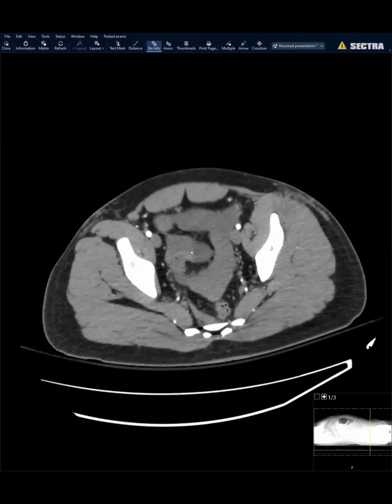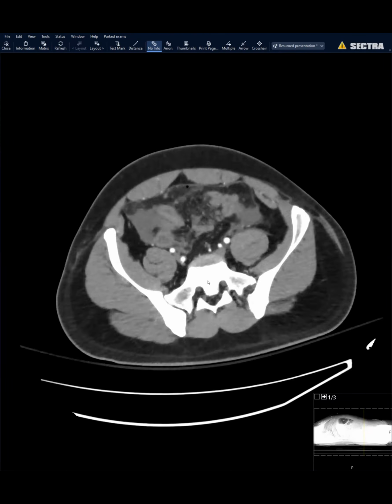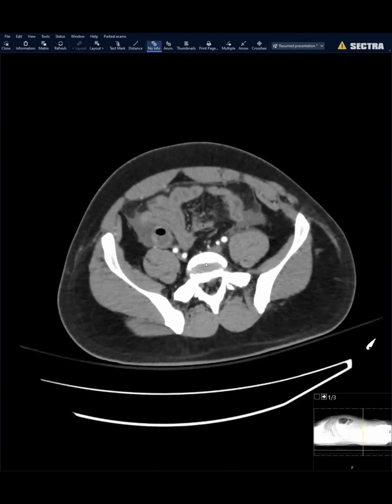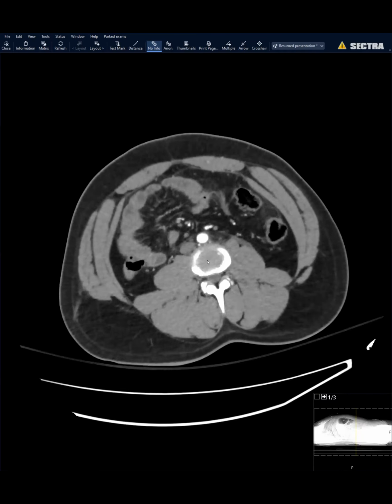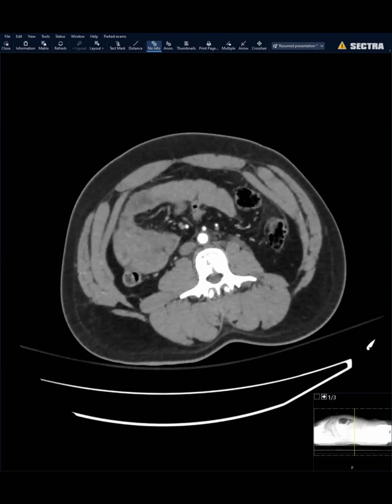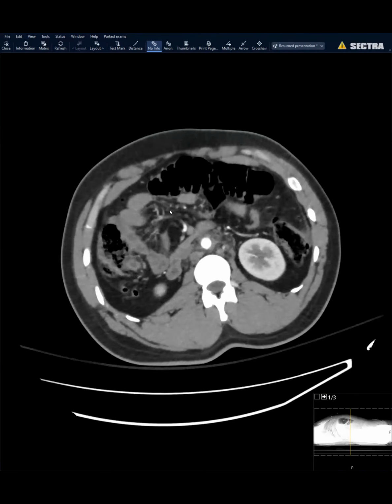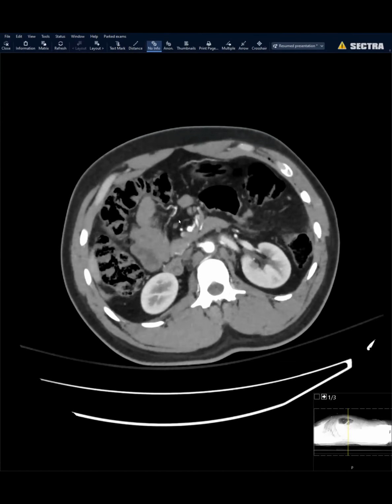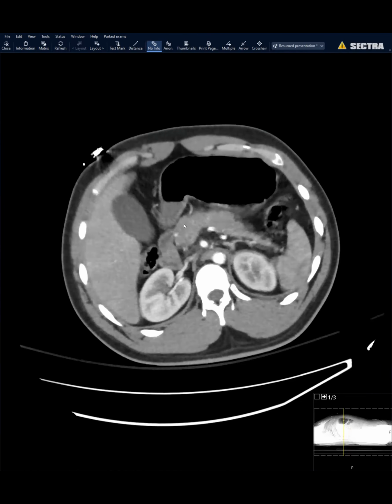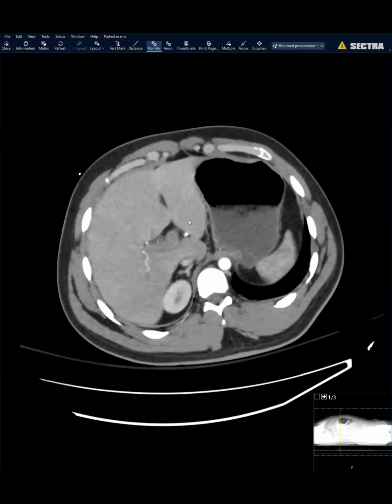So I think the first thing you can all appreciate is that there is hemoperitoneum. And if you look very carefully, you see a few punctate drops of air. I need to look very carefully again because I could barely see it the previous time. So you can see a drop here, maybe a drop there. That may be also just close to the bowel. So you see a couple of drops of air which just caught our eyes, and we were trying to figure out where the trauma was, and whether this patient had any other injury.